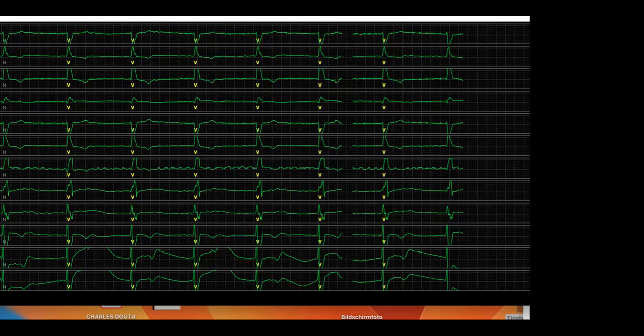If you have somebody who's got an ECG with maybe AV block grade 1, for example, you have to ask for further history, or some things you can just diagnose by seeing. If these people look trained, if they look muscular, and you spot maybe a first grade AV block, you don't have to worry much because, like we said, one of the causes is increased vagal tone, which is, to those people, physiological.